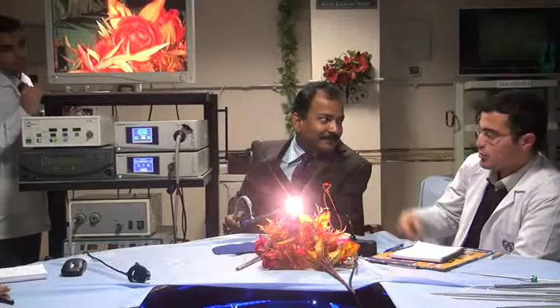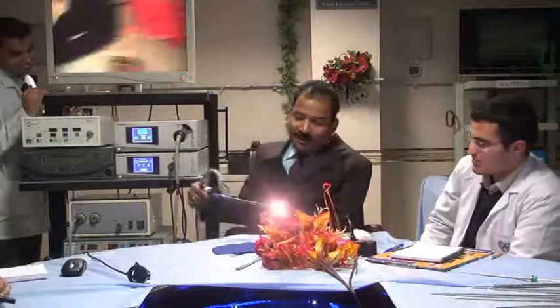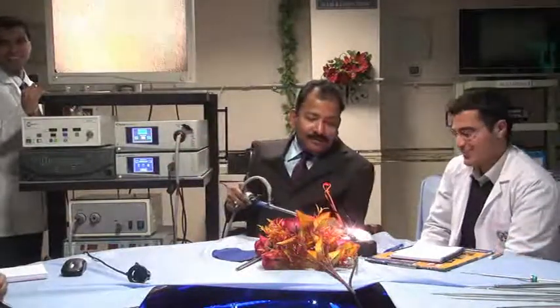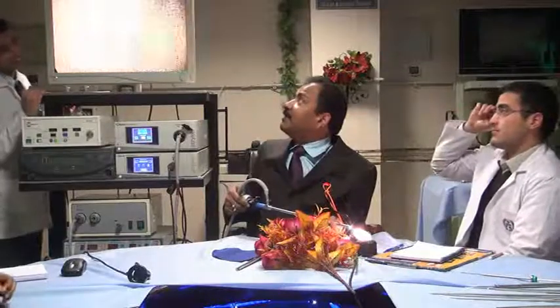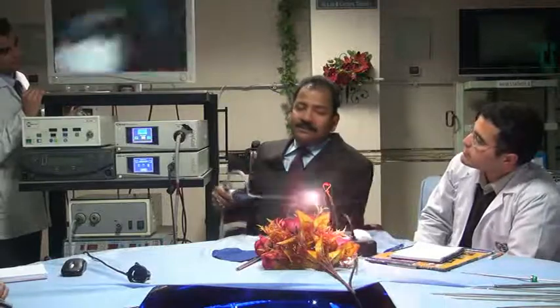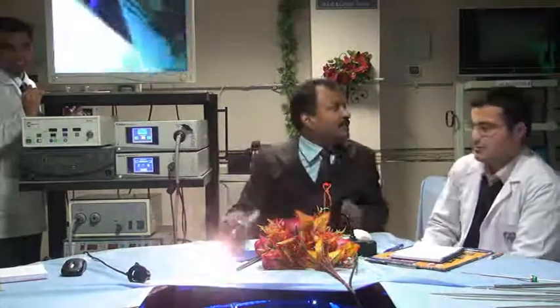With the white balance setup. So don't do the blue balance. This is blue balance. You have to do white balance. Yes, this is a white balance. And now once it is done, now this is better. So that's why white balancing will give you the removal of the impurities of the color.